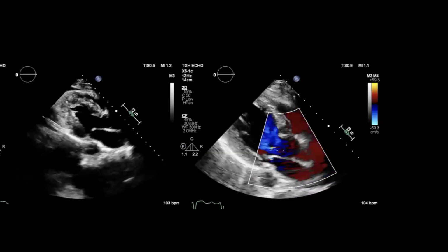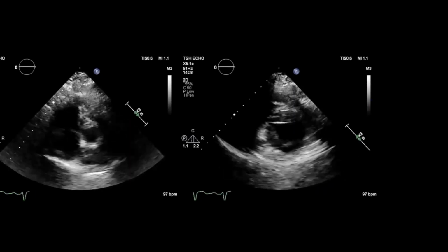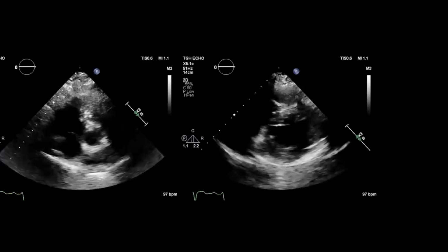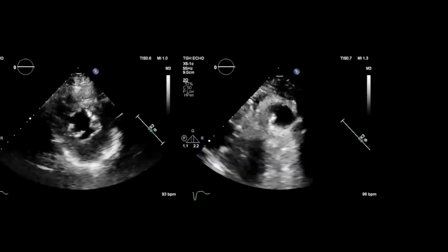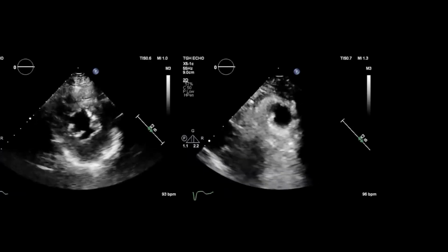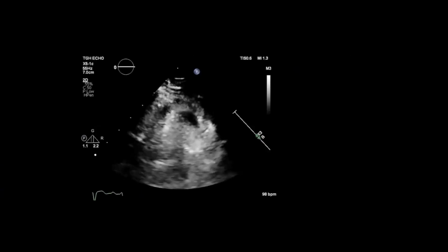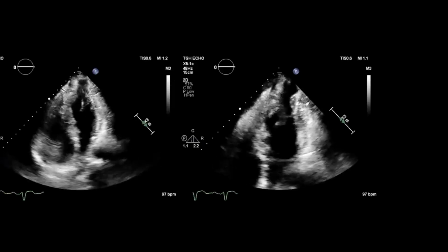Nothing crazy dramatic here, and I'll walk through things. If anybody has any questions or things you want to point out as I go through these, please let me know. There's some early short axis images. It turns out okay on the TV screen; it's a little bit better on my computer. And there's the mid LV, and there's closer to the apex. Another view here is right at the apex in the short axis. And then this is closer to the 4-chamber view.